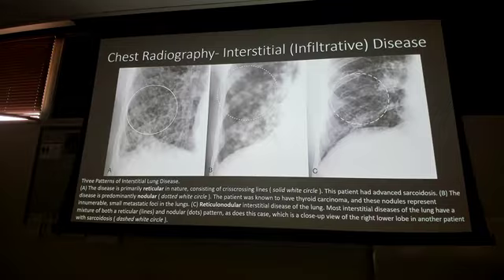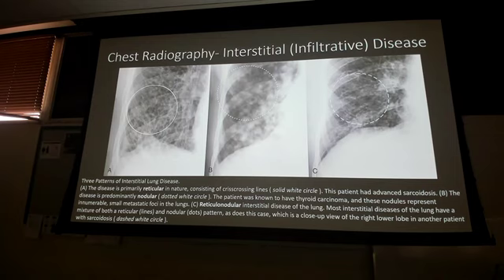Radial, lucid, circular, those are the nodules? No, the nodules are radiopaque. The nodules are radiopaque. Nodules are the areas that are not supposed to be there. The best way to look at this slide is to pull it up next to a normal chest x-ray. That's the best way to look at this one, and then you'll really see the differences.